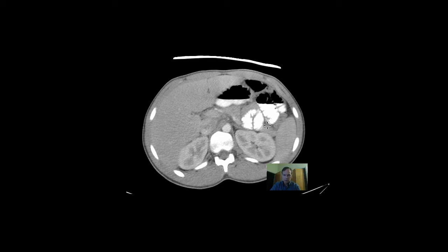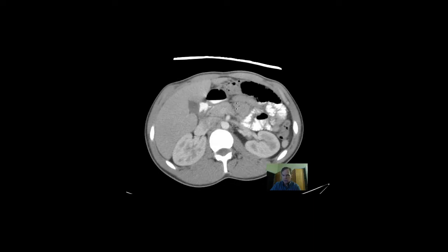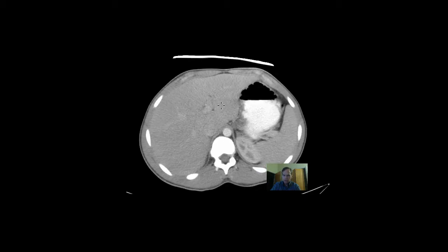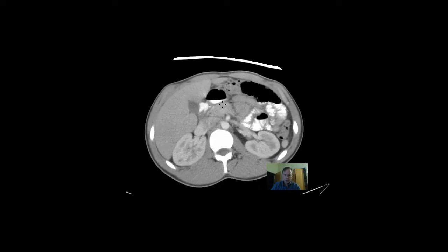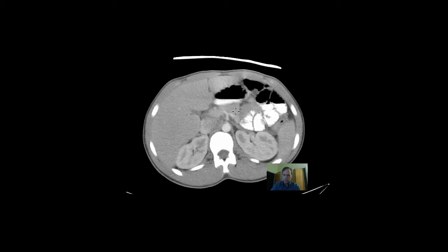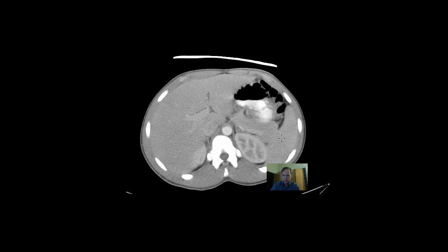You can see even the subcutaneous fat is minimal, and the retroperitoneal fat is minimal as well, so that tends to obscure the anatomy of the retroperitoneal structures and mesenteric structures. So here you can see the pancreatic head, and as we go superiorly from that, we come into the pancreatic neck and body, and the pancreatic tail, which extends and points toward the splenic hilum.